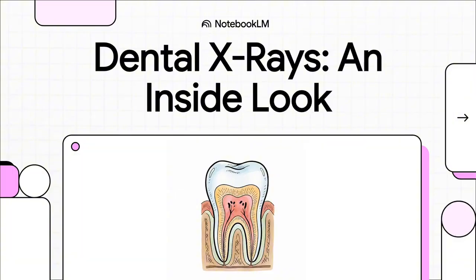Hey everyone, welcome back. You know the drill, right? You're at the dentist, they slide that little plastic thing in your mouth, you hear a beep, and boom, a picture of your teeth pops up on the screen. And most of us, we just assume they're on a hunt for cavities. But today, we're gonna peel back the curtain and see what those black and white shadows are really telling us. It's a whole hidden world in there.